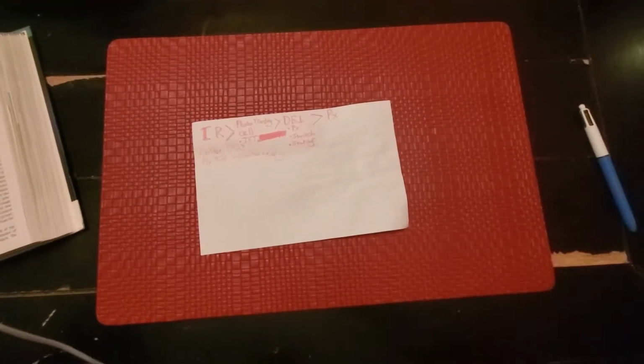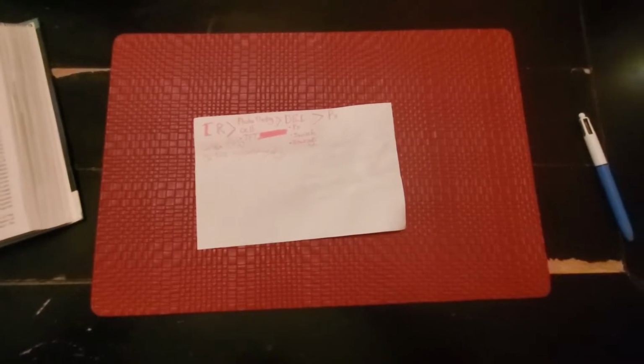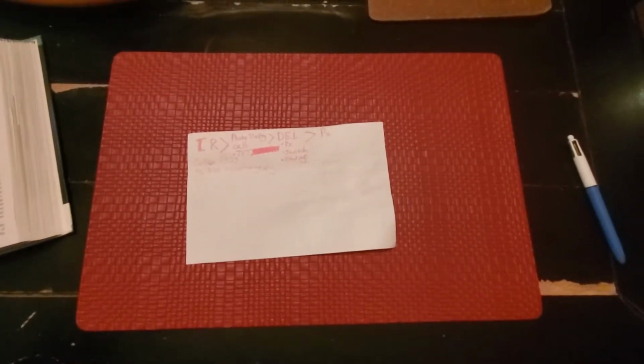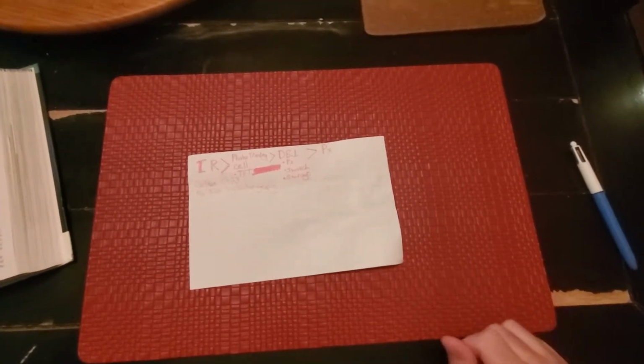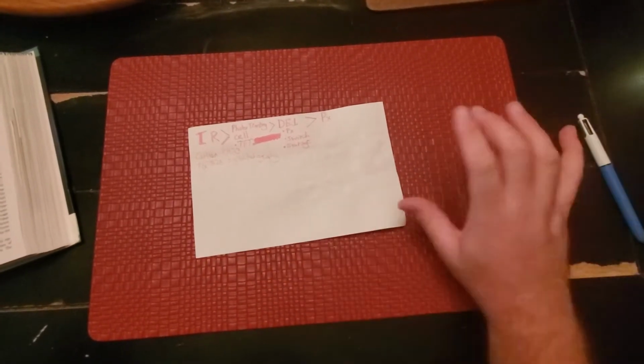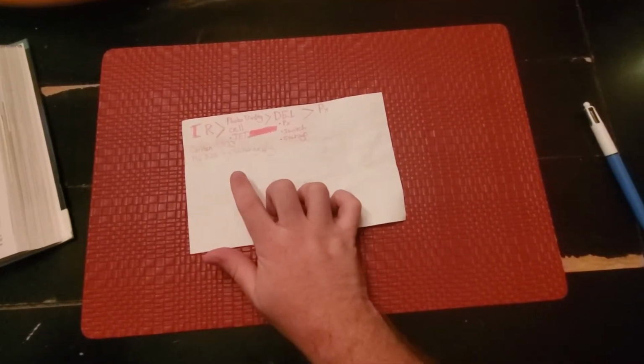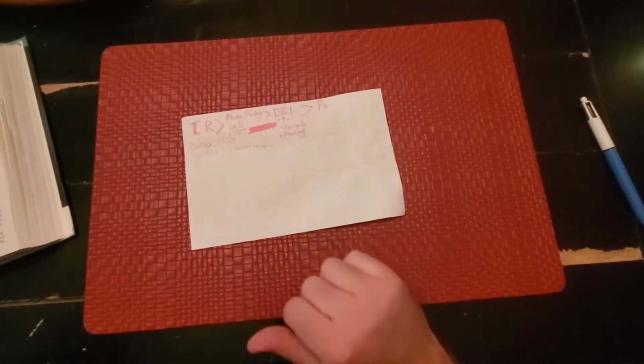I'm holding my phone at the same time, so I'm going to try and do this one-handed. We'll follow along with Carlton Chapter 23, page 325, Digital Radiography.